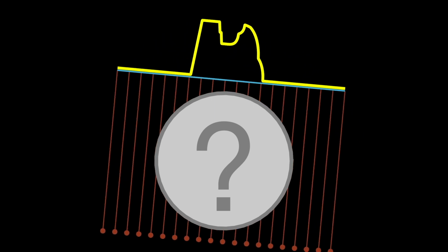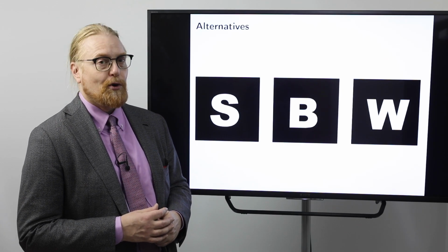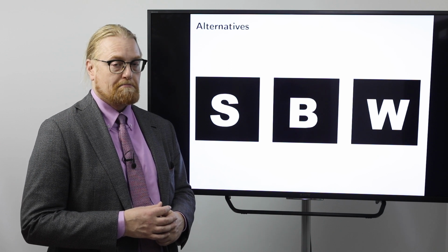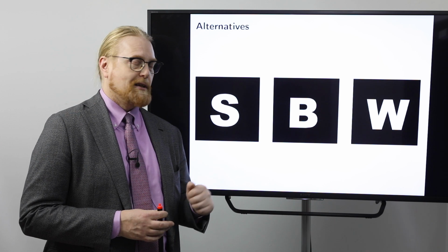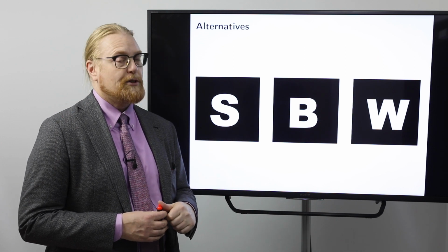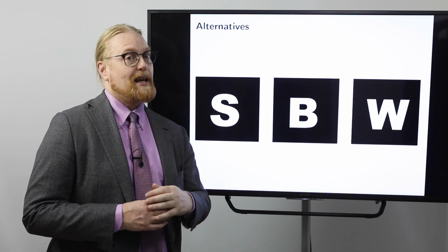Okay, getting harder. This is one of the characters in the Western alphabet. But which one is it? It is either S, B, or W. Can you guess what it is? Please check back with the data a little bit, think about it, and come up with your answer. Remember to look carefully at the vertical X-rays.